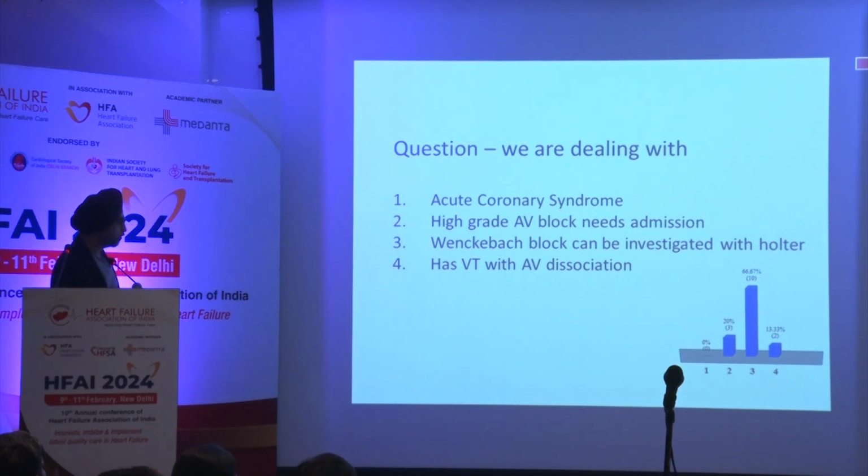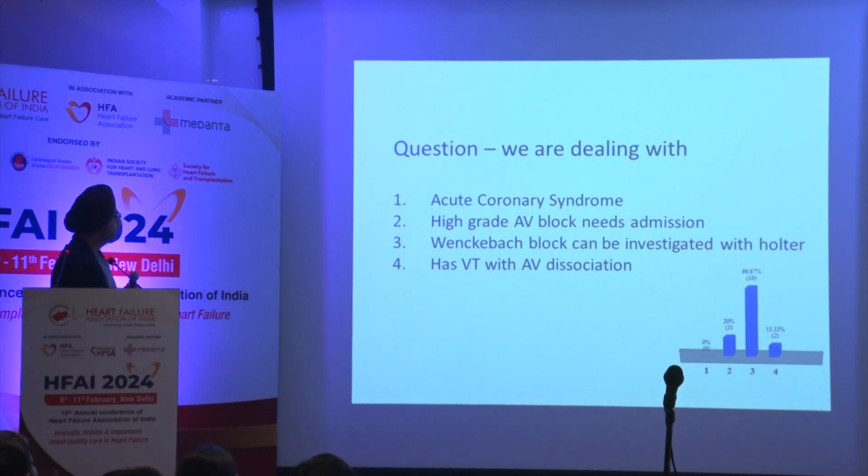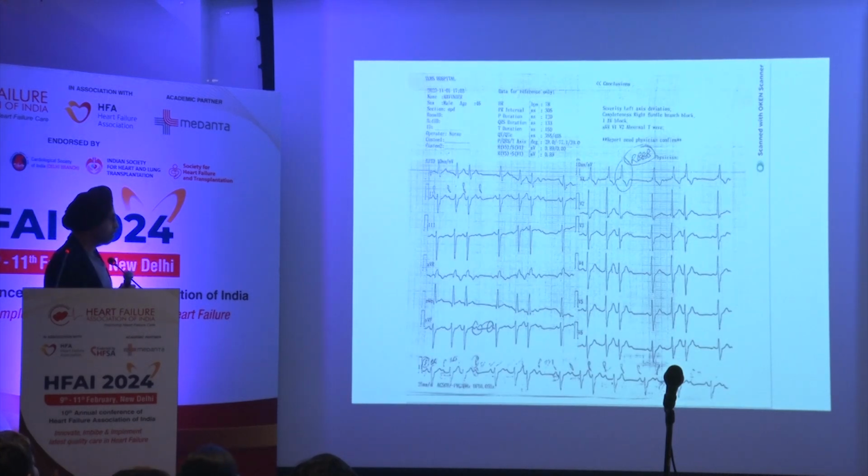So we have an interesting response. Most people would think that let's let him go home. So let's go back to the ECG. So how people would have missed this.